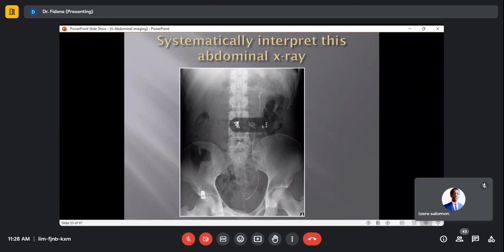About rotation, I have said that it's a bit related, because I said that the distance from the left sacroiliac joint to the spinous process is a bit larger than the right one. No, it's about distances, from here to here and from there to there. Are they different really? By estimation they are the same. There is no rotation here.